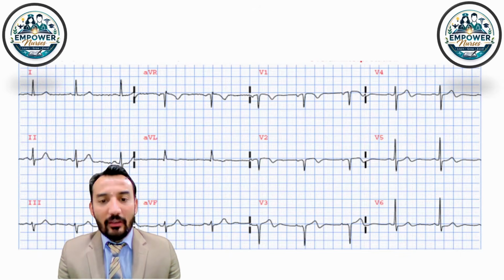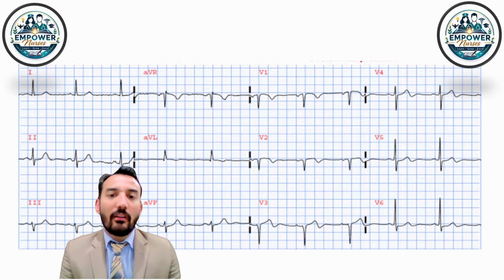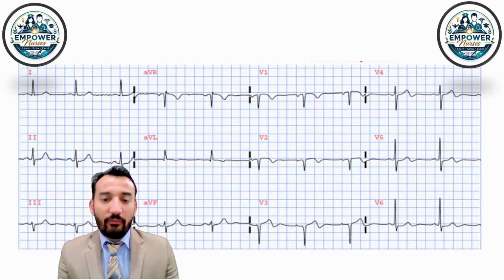What are you looking at? It is an ECG tracing, but do you know what it is in reality? In reality, when you are looking at an ECG tracing, you are looking at a human heart from different angles and sides. You would be wondering how. If you really want to understand that, please watch this video till the end.